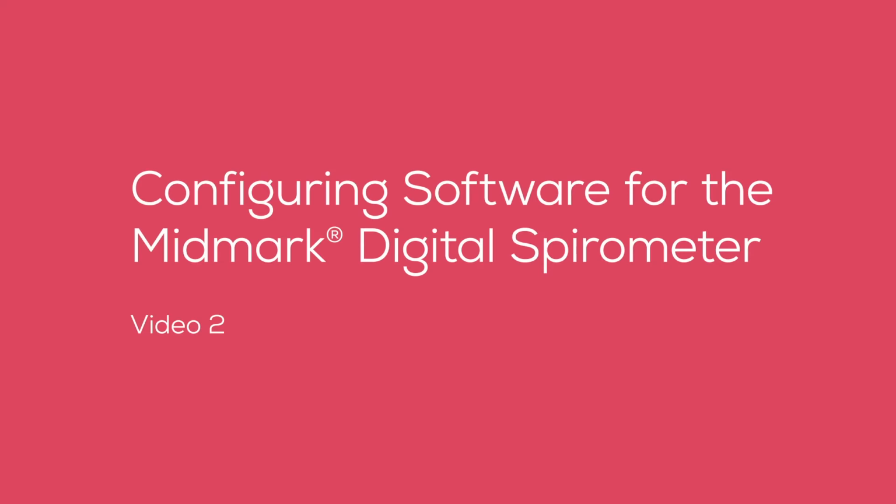This video is the second in a series of 6 videos created to provide an overview of the Midmark digital spirometer. This video will guide you through the software configuration process.